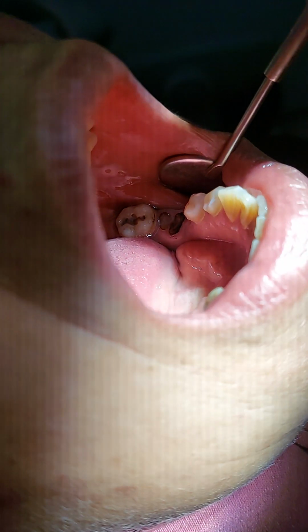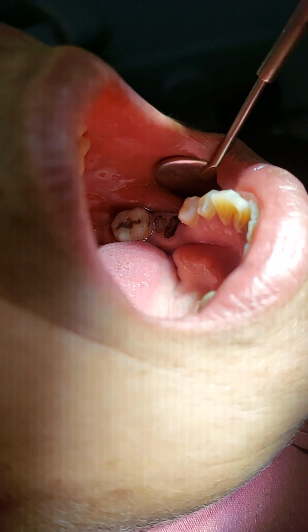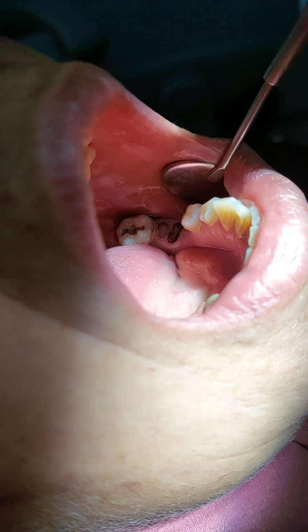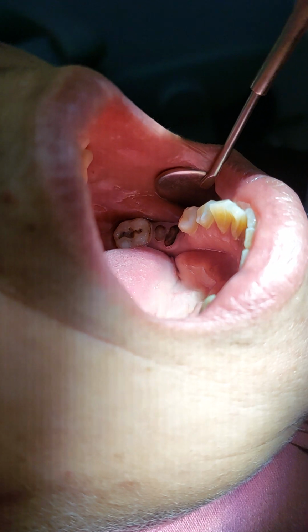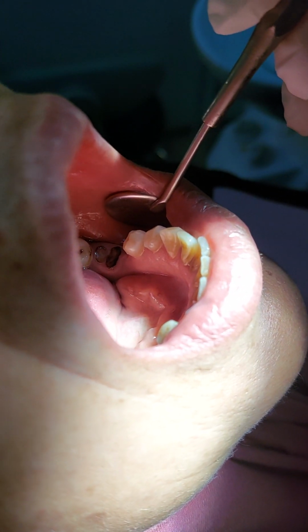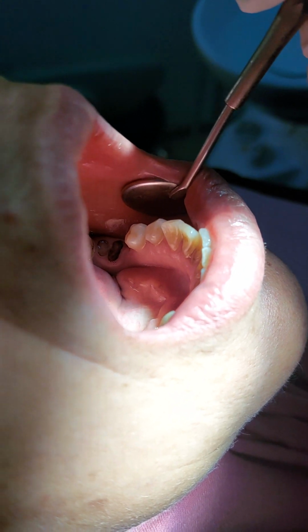I'm talking about actually what is it. What is it? 7. Okay. What do you see? You see some roots, right? Yeah. But don't you see in front of the roots there is some space? Yeah. And the 5 is tilted distally. When does this happen?